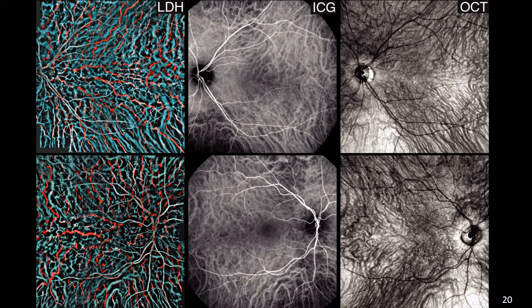It has been completely critical also to study the choroid, because as I explained in another presentation, choroidal arteries are revealed by high frequencies because they have higher flow, so we didn't really need the SVD to reveal them because high frequencies are anyway free of eye movement. But choroidal veins have slower blood flow, so they are revealed by lower frequencies, and for this it was absolutely critical to have a clean signal at low frequencies. So these are the montages that we were able to make of the choroid with the SVD filtering, and it brings a lot of information compared to ICG and OCT.